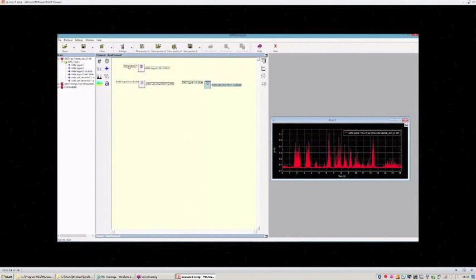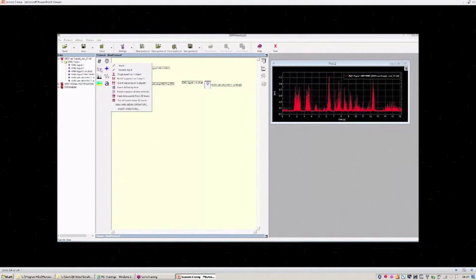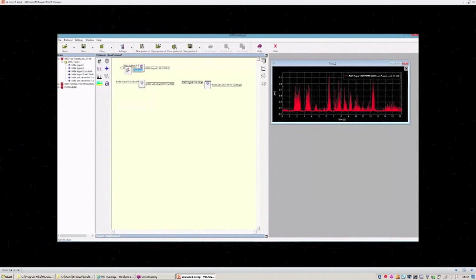So now imagine that we want, for example, to compute the average of the rectified signal between two events. So we have to define the events first. So we have to select the event operator. Okay, so for example, we can define a start and a stop time event.